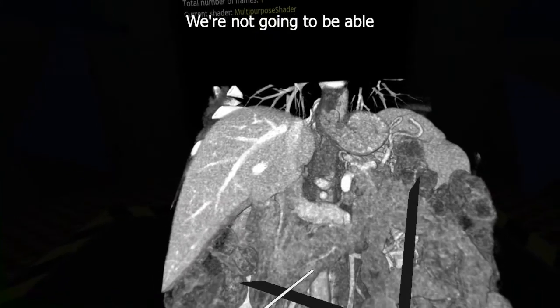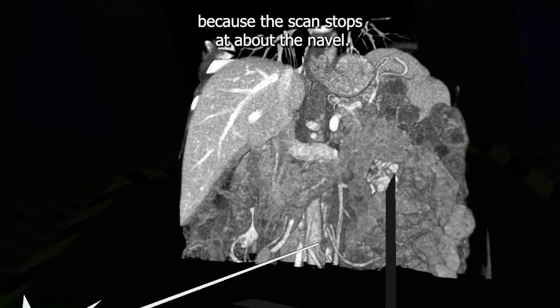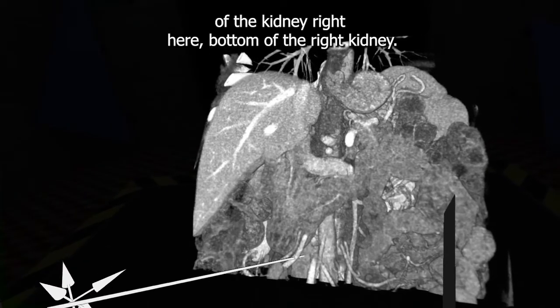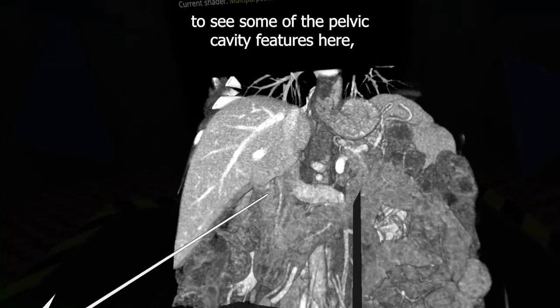We're not going to be able to see the inferior mesenteric artery because the scan stops at about the navel. You can see the bottom of the kidney right here, bottom of the right kidney. And so we're not going to be able to see some of the pelvic cavity features here.